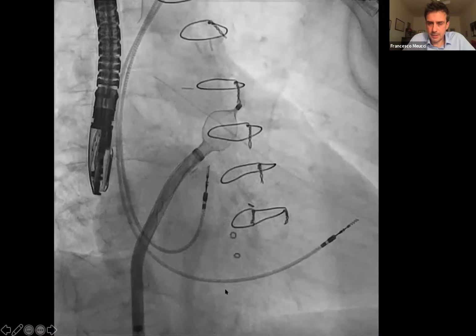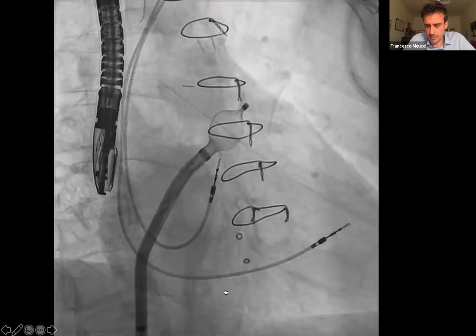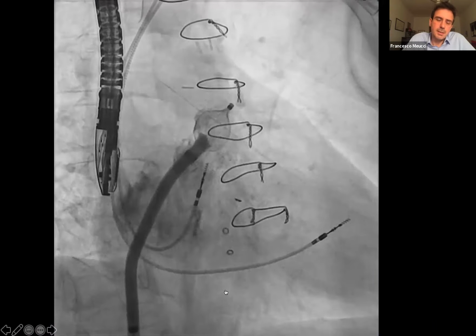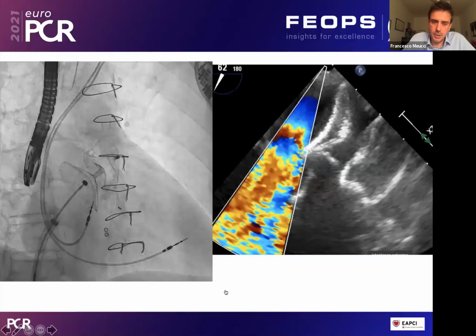And this is the positioning of the lobe of this device. If you are experienced with this device, it's the lobe with the ball-shaped morphology, and then the disc that has to be positioned outside the appendage. And as you can see from this still frame, the distance between lobe and disc was good. The deformation of the lobe was good. What was not good is this moving image.